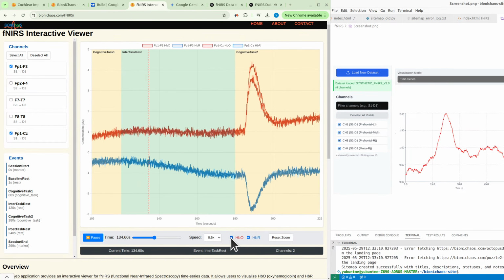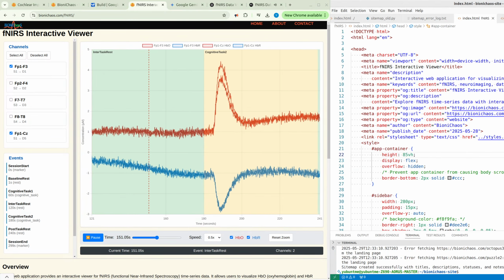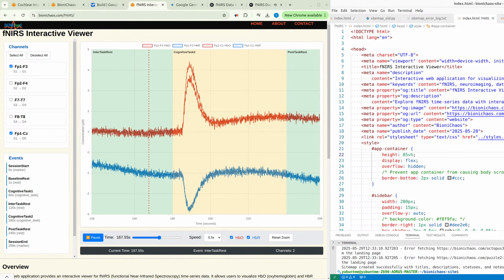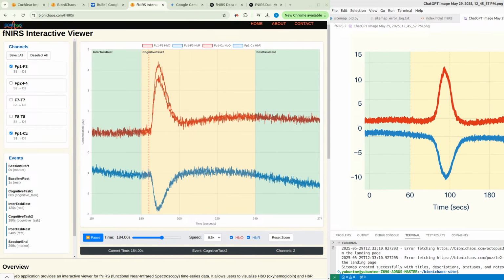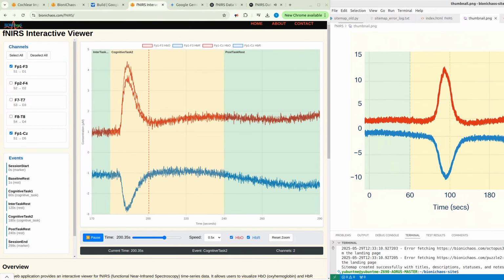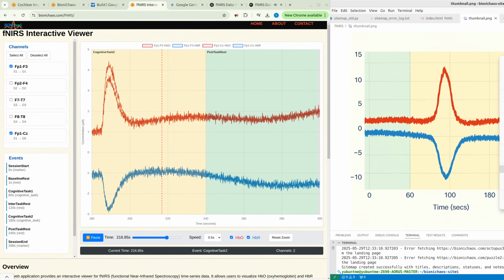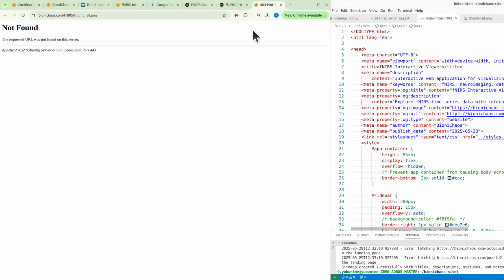Okay, so putting it all together, this tool isn't just showing a static image, it's really interactive. Absolutely. The source calls it a full-featured temporal brain activity navigator. And that seems fair. It's designed to take this messy, multi-dimensional fNIRS data and make it explorable. Helping researchers see when and where activation happens, how things change from task to rest, compare different brain areas. Yeah, all of that. It helps interpret those hemodynamic responses in the context of the experiment. And the source seemed pretty positive about it, calling it dense, but in a good way. Like, lots of info and control, but usable, tailored for the people actually doing this research.